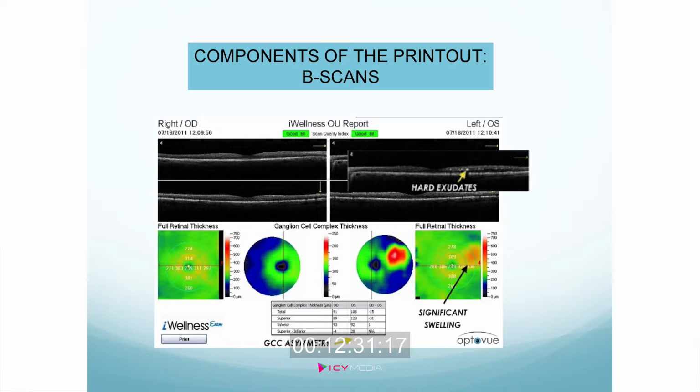You can see that little hyperreflective spot, which, if we're looking at a diabetic, we can assume is an exudate. Exudate occurs in the outer plexiform layer. It's not the best scan, but that's where it would be. If you weren't sure what it was, we're going to do much more specialized testing later to hone in on the abnormal area. But you can clearly see there's something going on here.